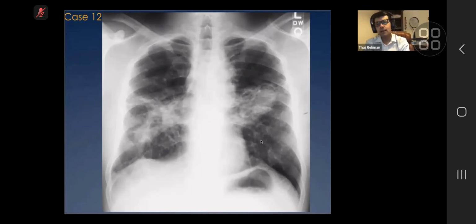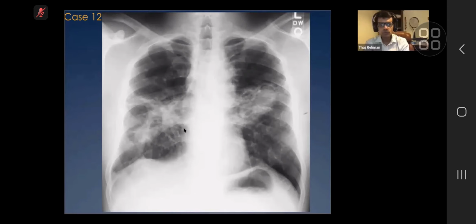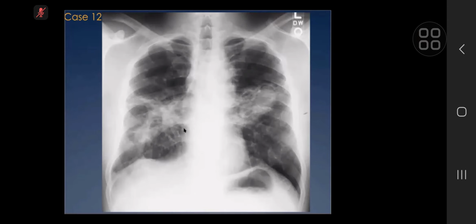You did say that the lungs appear hyperinflated and emphysematous. So when you say the rest of the lung is hyperinflated, how can you put IPF in the differential? How can you put interstitial fibrosis? Yeah, you're right. Yeah, go ahead. So background scarring of the lung. Now these two bilateral hyperdense lesions.